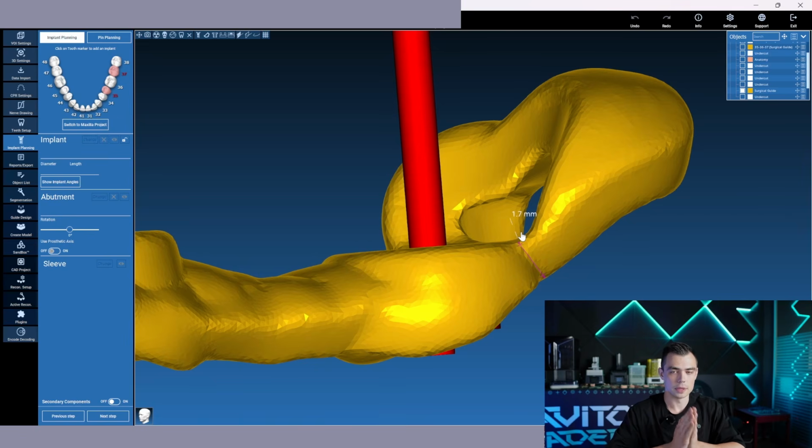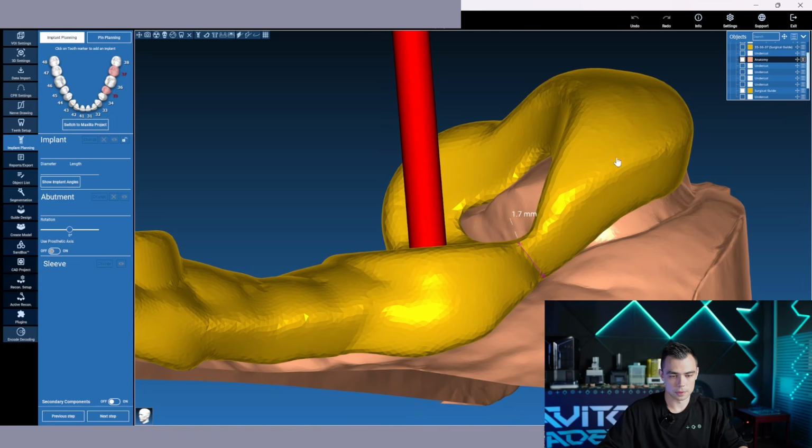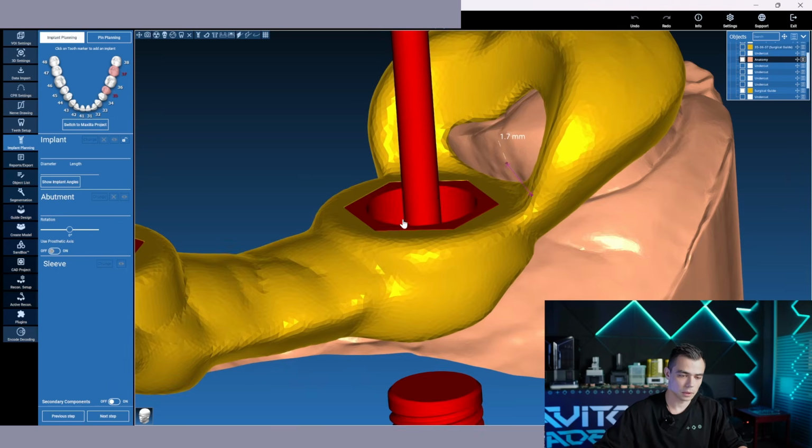I mean, in this area the surgical guide will most probably crack, because this part of the guide is lying on the tooth, and these parts of the guide with the sleeve are experiencing a mechanical load. The surgeon presses with a drill, with his tool, on this area, and most probably it will crack during the operation. That's actually problem number one.